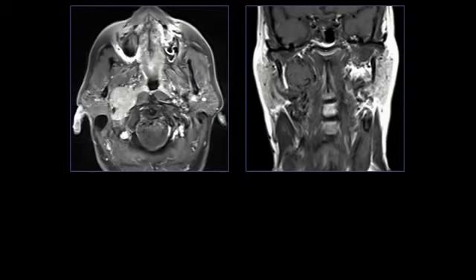We can also take the lesions that leave the surface of the pharynx. So if I'm a big tumor and I leave the pharyngeal mucosal surface, where am I going? Back then, you'd say it's invaded the deep tissues. Now we talk about the spaces and the structures that have been invaded.